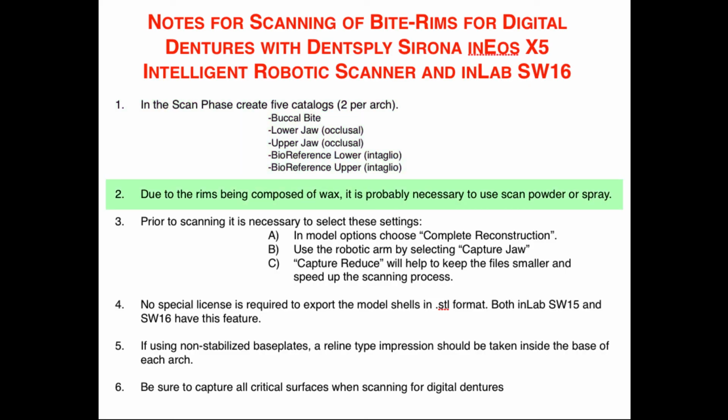2. Due to the rims being made out of wax, you're probably going to have to use some kind of powder or spray. Your choice of what kind. Again, don't cake it on.